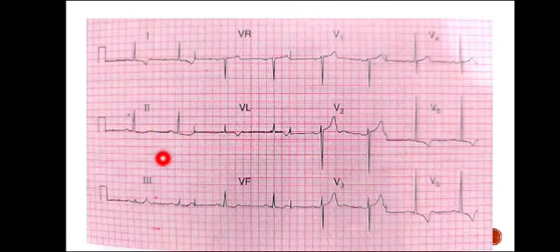But if you look at the T wave inversion, this is again an asymmetrical T wave inversion. One limb of the T wave is greater than the other limb. Also over here it is very prominent, over here it is very prominent. So this is a strain pattern. When you find a strain pattern in the lateral leads, you know that the lateral wall is mainly formed by the left ventricle.